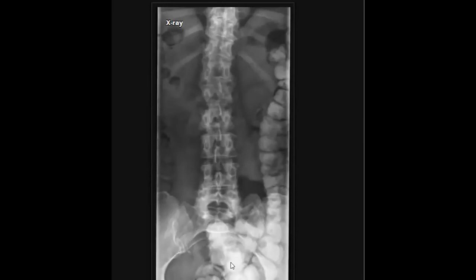So I will try to help you because it is rapid reporting. So go with the checklist to think about the pedicles. Which level is affected? Which one? 5, 4, 3, 2, 1. So maybe one, yes, here, absent left pedicle.